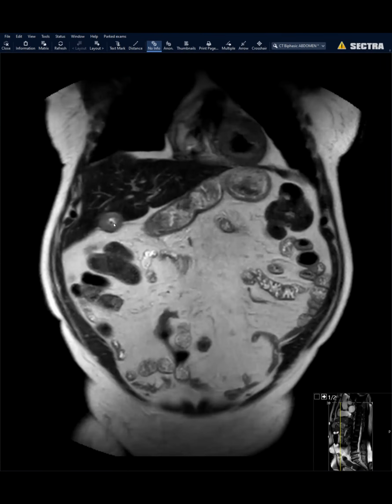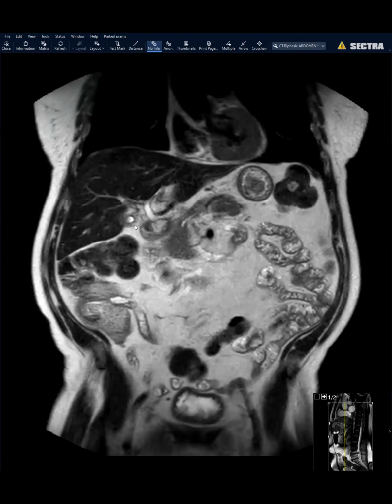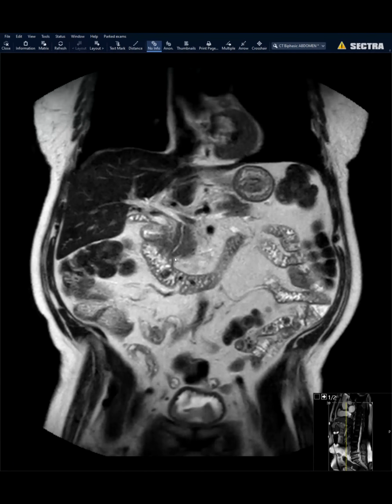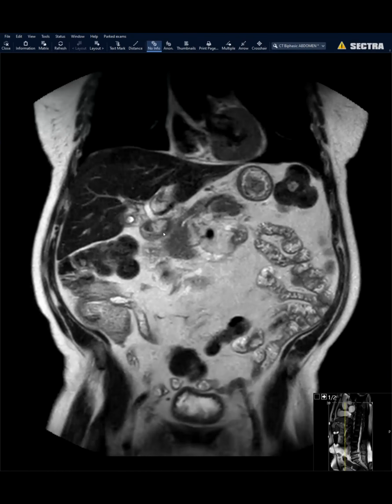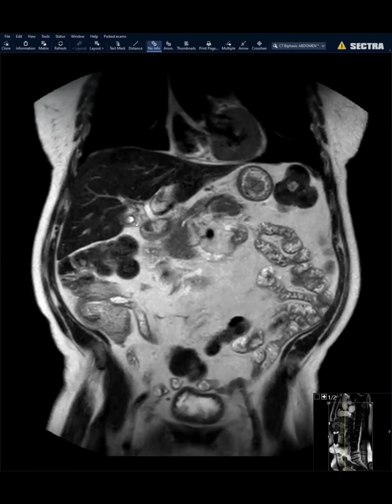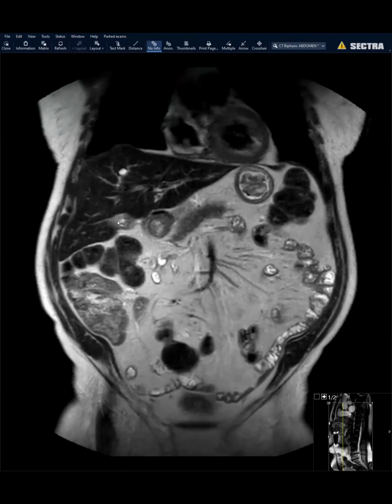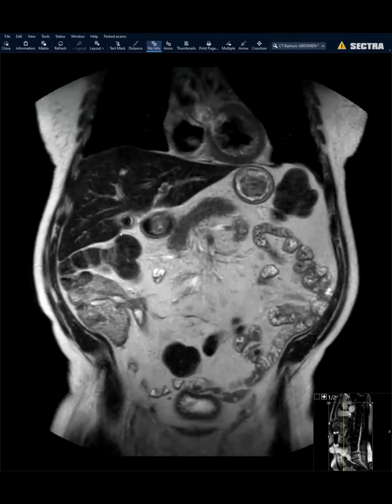And this is the gallbladder. And there was a stone right here. That's the cystic duct, and that's the intrahepatic bile duct and the CBD in the pancreatic region. So what's happening here is that most likely there was a stone here, and at that time the patient presented with probably some symptoms of gallbladder inflammation.